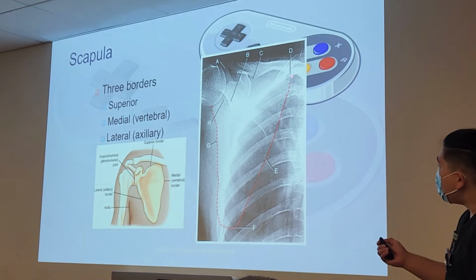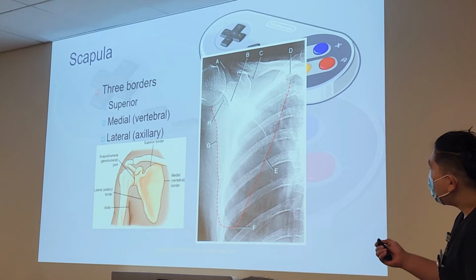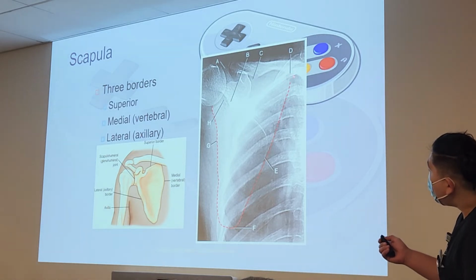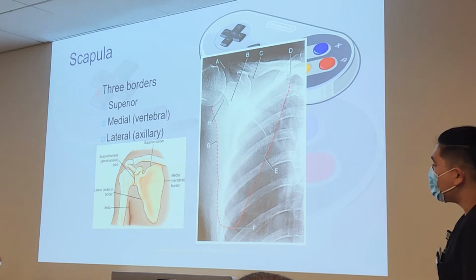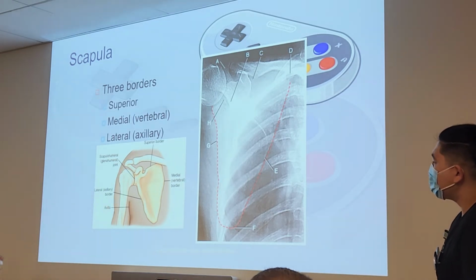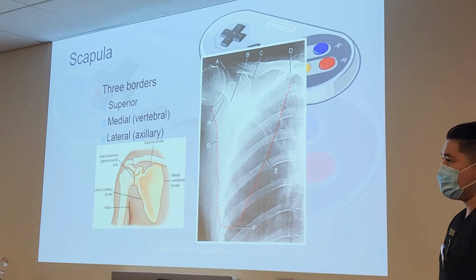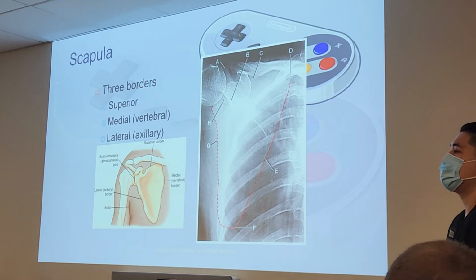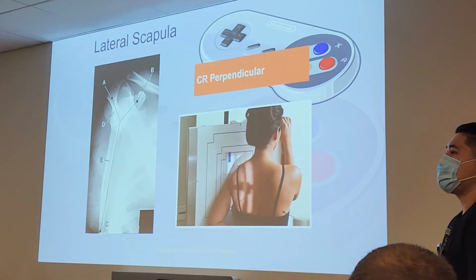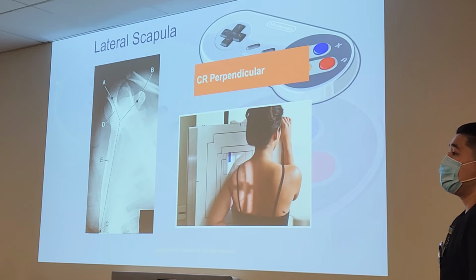I think we didn't go over D. Second rib? So that's actually two things. Yes, it's second rib, but it's approximately where that superior angle would be located. That one's very difficult to see on this X-ray. So either of those answers would technically be correct. That's a good one to review.